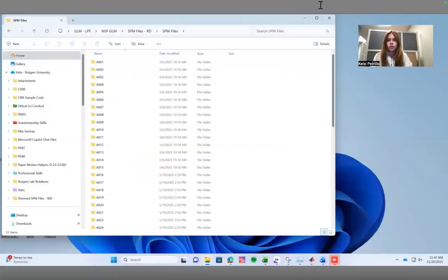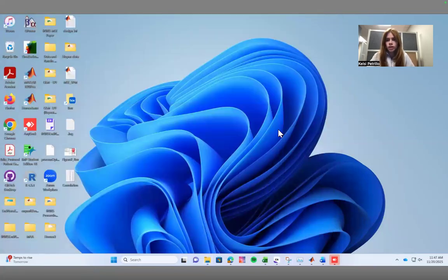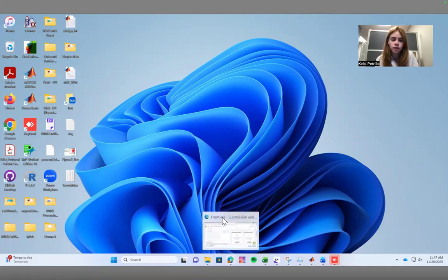Okay, so in order to run NIRS KIT, there are a couple of things that you'll need. The first one is MATLAB. Any version post 2012 will work. I always recommend just installing the latest version of MATLAB. You'll also need to download NIRS KIT and some related toolboxes.